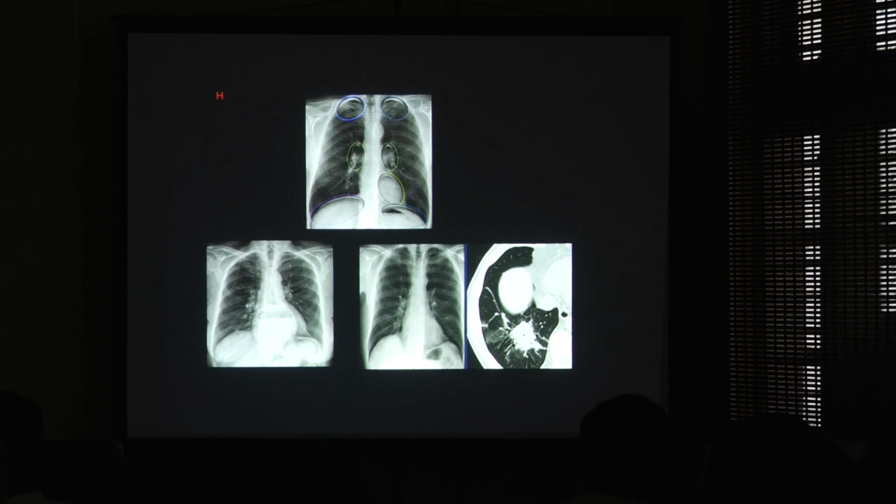Or you have lung behind the heart. The lower lobe is there behind the heart. If you have got a lung abscess with an air fluid level, again you can have this air fluid level in the retrocardiac region.